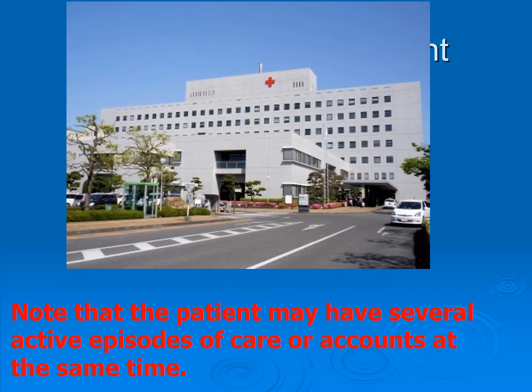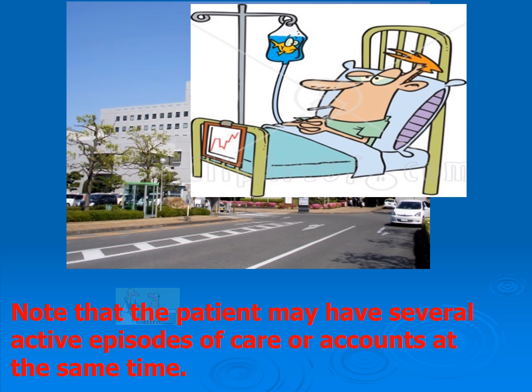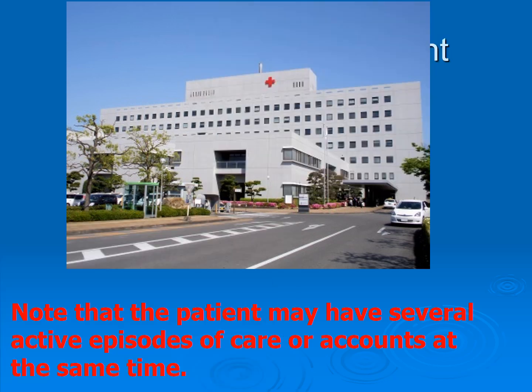Note that the patient may have several episodes of care or available accounts at the same time. They may have been admitted under the surgeons as an inpatient, but also have a recent active outpatient account under the medics. The account in use today should be the inpatient account.